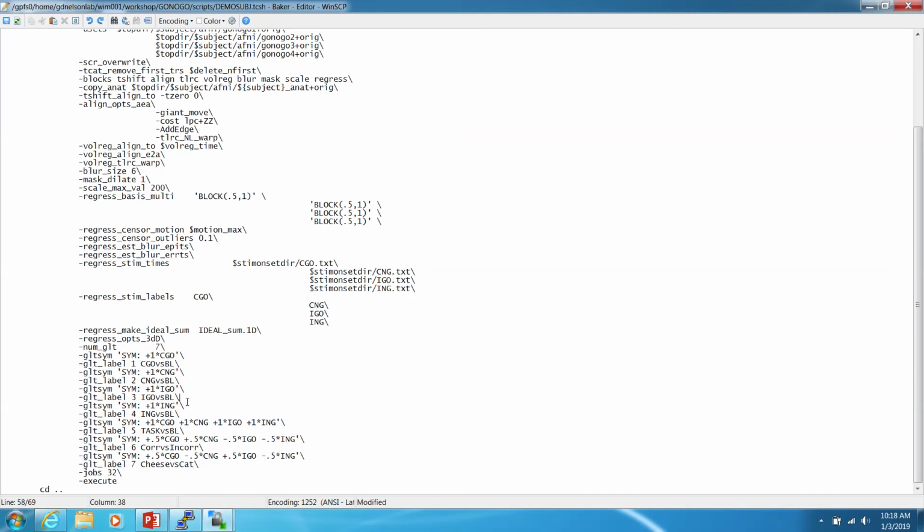You can also compare, like down here, our correct trials versus our incorrect trials, and that instead tells us relative differences in activation between two events of interest.